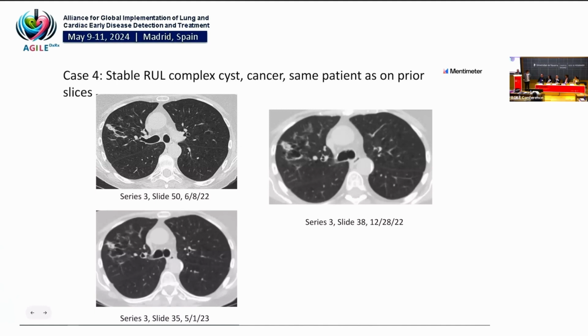So you all think 1 year, and you think it could be something else? Like what? No. For me, it looks very much like an old lesion in the lung, and I will follow it in 1 year. Okay. So can I have the next slide, please?